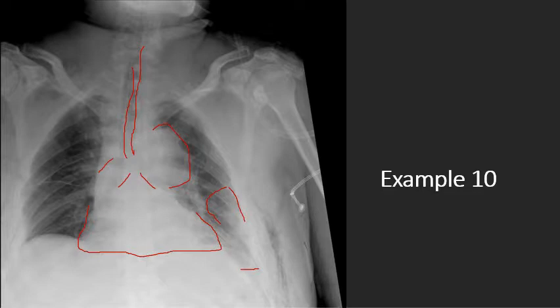And then everything else, tubes, lines, and drains. So we already mentioned the endotracheal tube right here. We see on this side, what's this? That's subcutaneous emphysema. That's bad. And then you see air tracking right here. I'll erase that so you can see that again, but that's not normal. But more importantly, the topic of this right here is this right here.